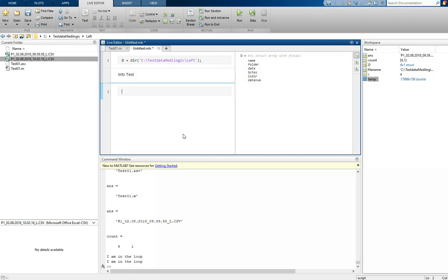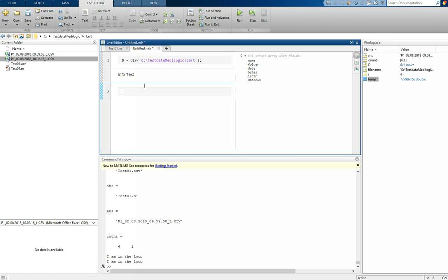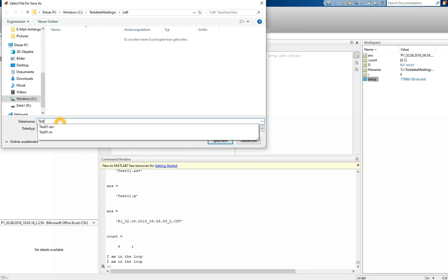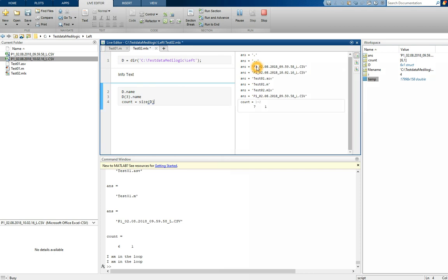So what we've done next is to copy that one in, only to have the things in the same place. We save it in the same folder and give it the name test02, save it, and then we can run all, and we should get a specific answer, so that's okay.